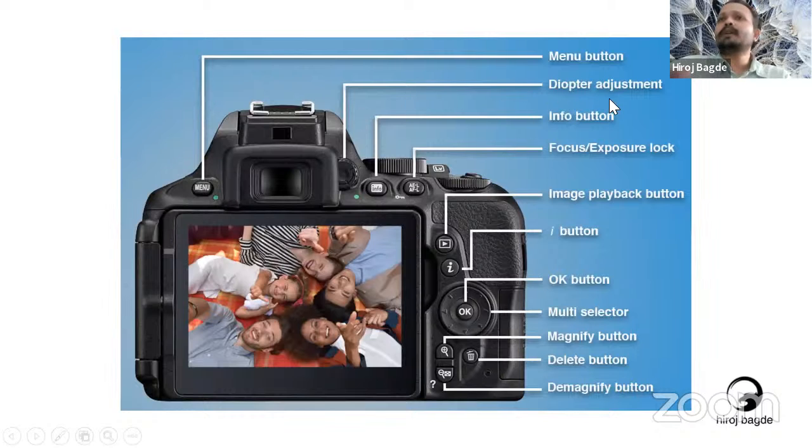This is the menu which is being shown inside, and we can modify all kinds of parameters. I will go in depth. Then we have something called an info button here, and this is the diopter adjustment. Diopter is about the lens and its categorization inside the camera itself, so we need not go into details of this for dental art photography. Then we have information about every type of thing we are going to go into inside the menu; we can get info about it. It will tell you about different kinds of factors. So, suppose I want to know what P is, then if you press the info button, we'll get the knowledge about P.